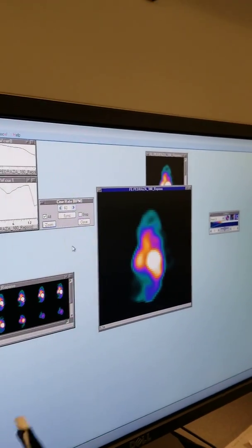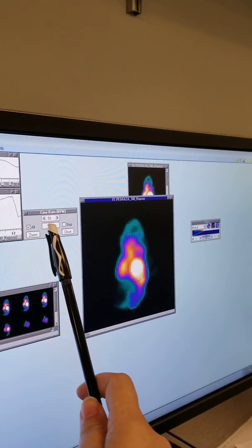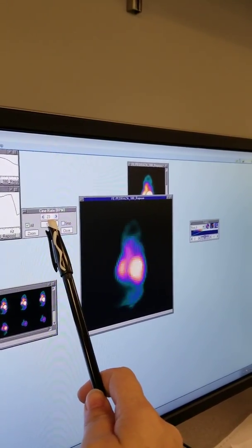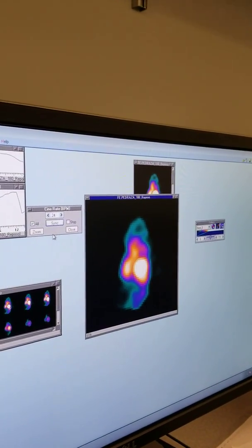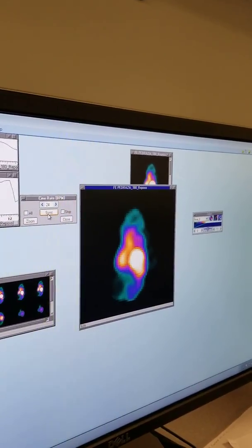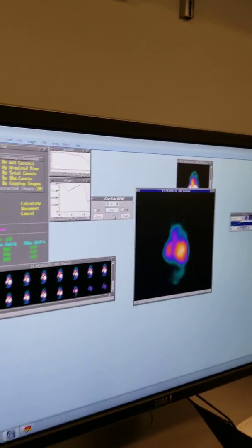And now we need to adjust the rate, which is here. The 60 is your default, 60 beats a minute. Ms. Vicky adjusted ours to 24, so slowed it way down. So you're going to put it down to 24, nice and slow. Look at how slow that is. Somebody's dying. Okay, but not our problem.